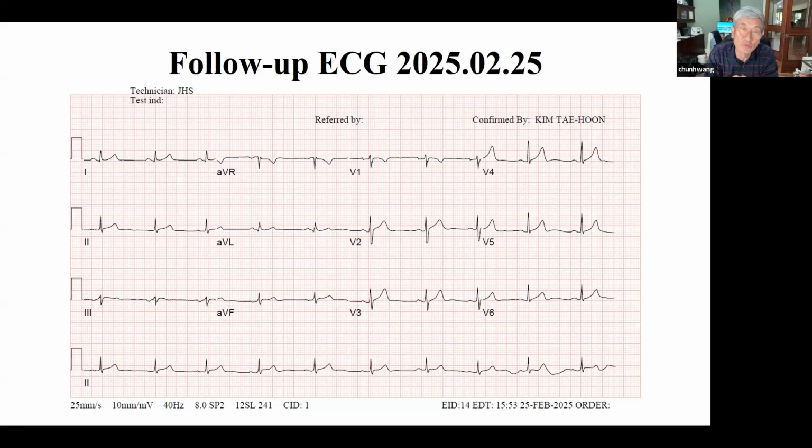Lastly, the importance of this case is that the patient fortunately has only ectopic atrial tachycardia. That does not mean this patient is going to remain like this. The patient may develop in the future focal atrial tachycardia further distal in the vein, even atrial fibrillation. Lastly, if you are going to do transseptal catheterization in these people, the left atrium is smaller than normal because of the persistent superior vena cava presence. Basically, it doesn't let the left atrium develop full dimension. So transseptal may be a little challenging.